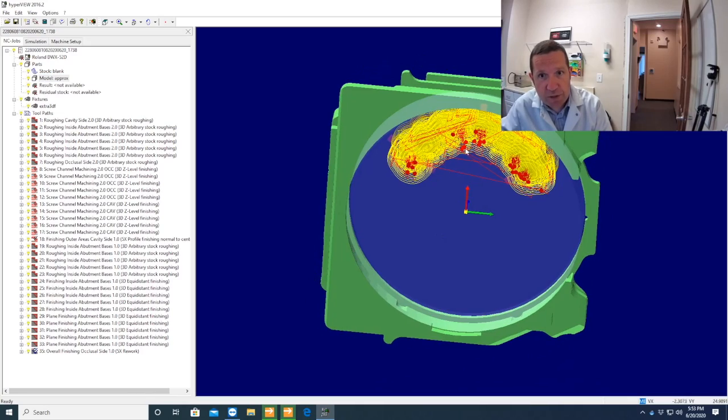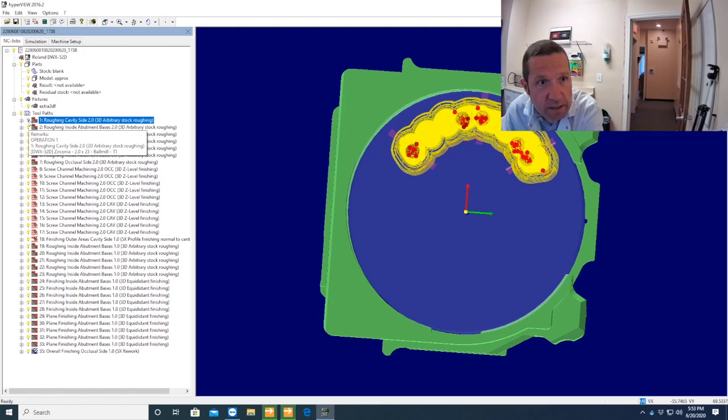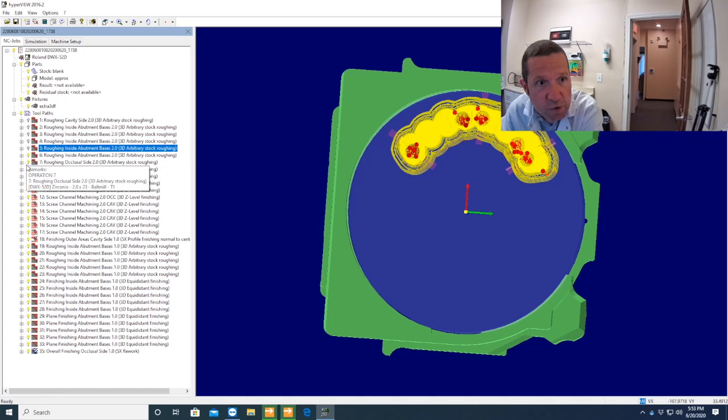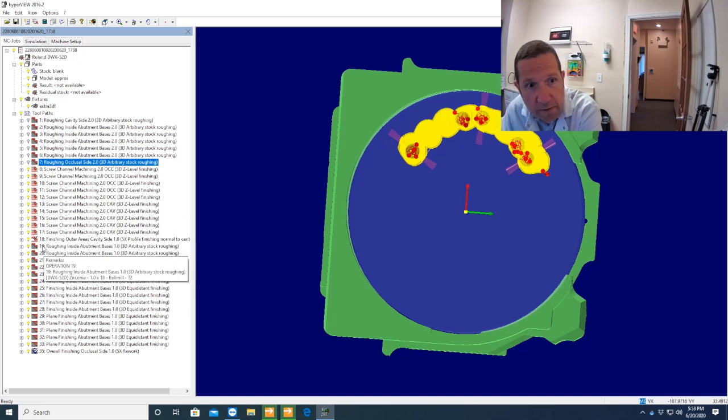But we want to get rid of the yellow stuff in order to see how the job is going to look after it's milled. There are some light bulbs here. We click on them, and by clicking on them, that disappears. Roughing. We want pretty much to keep only what says screw channel. Screw channel, leave it; screw channel, leave it; screw channel, leave everything.